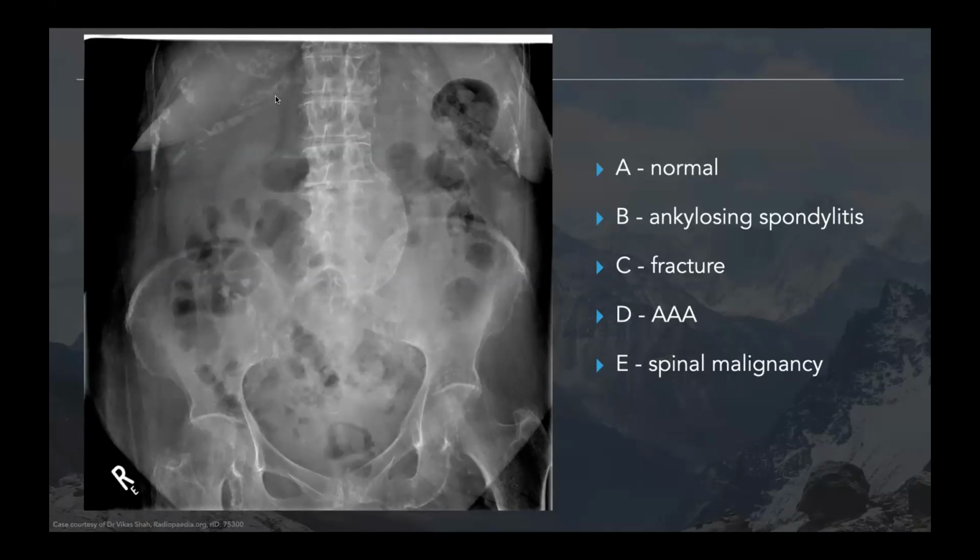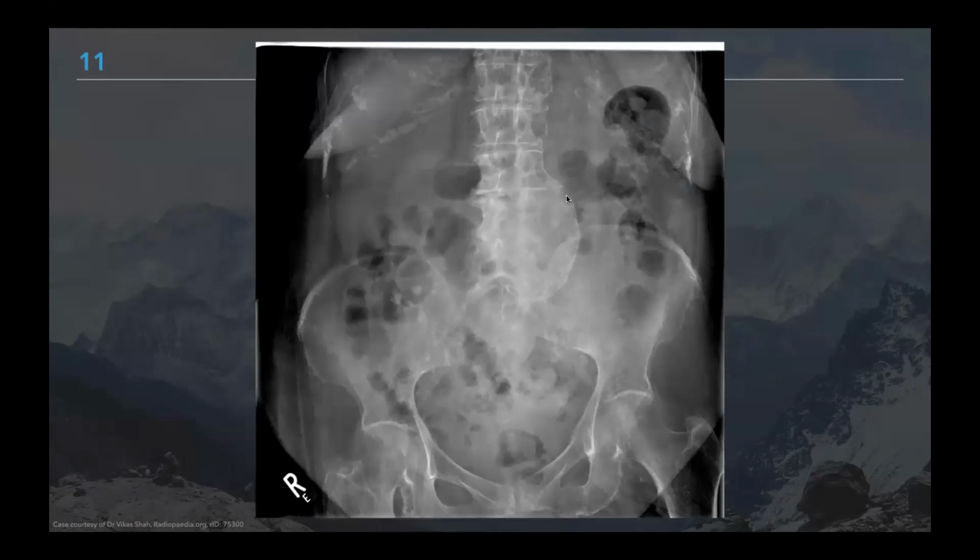Yeah, well done. So this is hardish, but you can see there's this calcified ovoid structure here. So remember, the IVC runs on the right and the aorta runs slightly to the left, which is where this is. They've got vascular calcification elsewhere, if you follow my pointer. They're also quite old and generally crumbling. But this is a peripherally calcified abdominal aortic aneurysm.